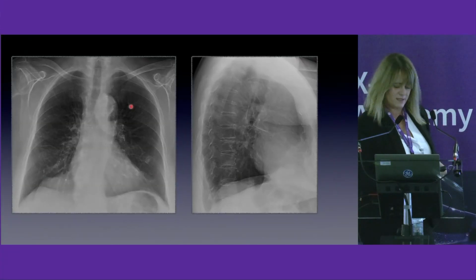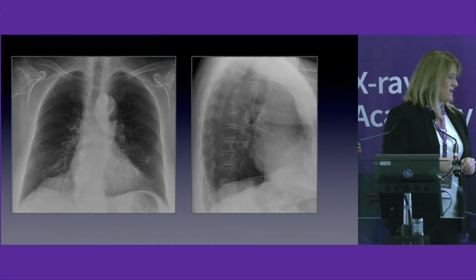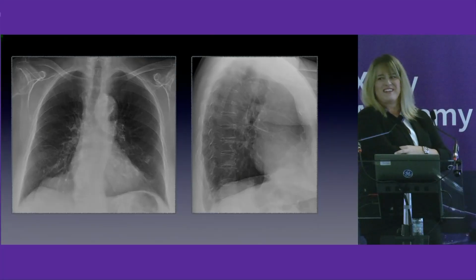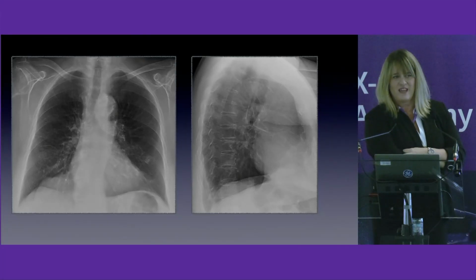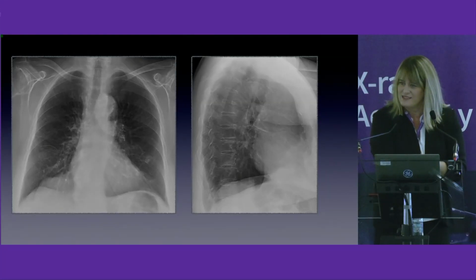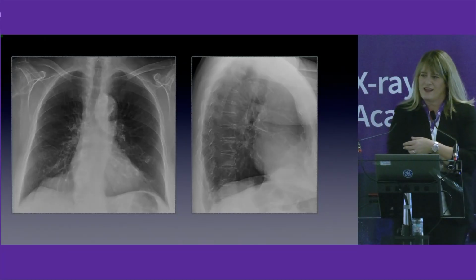What about this patient? As you can see, our population is quite old. In Trieste we have the oldest people in Italy, so we are facing this kind of problem daily. So is it a true lesion or is it just because of dysmorphic bones or something like that? Can anyone see anything?